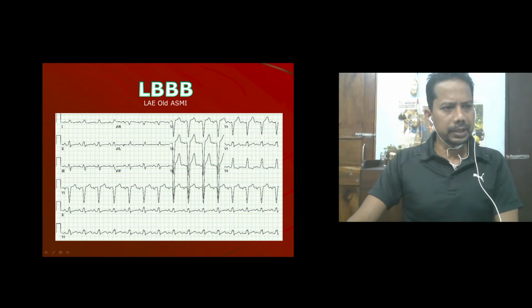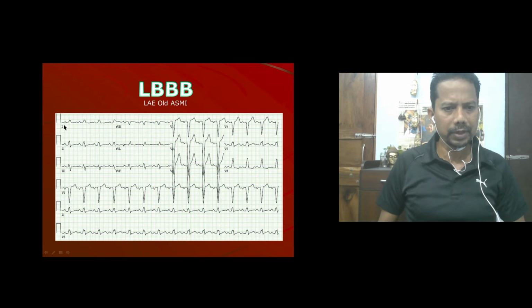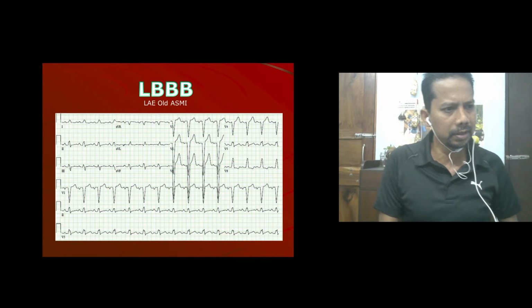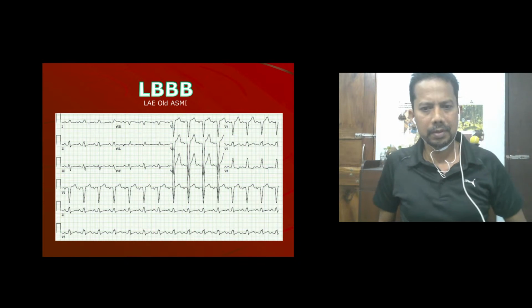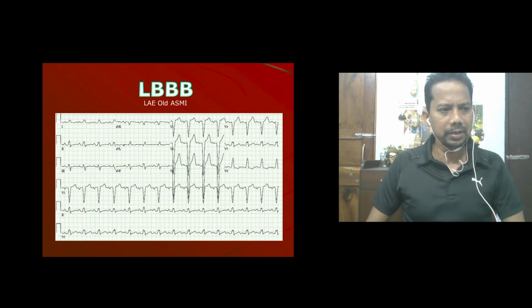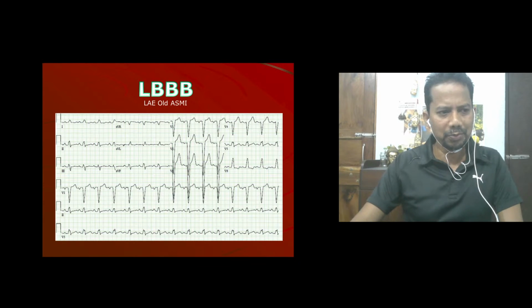Now, look into this ECG. Anybody please look at the ECG, Lukanwani, Dileshwar, Nazima, Sankavi. Please comment in the box so that I know you people are understanding, because otherwise it feels as if I am talking to the laptop.